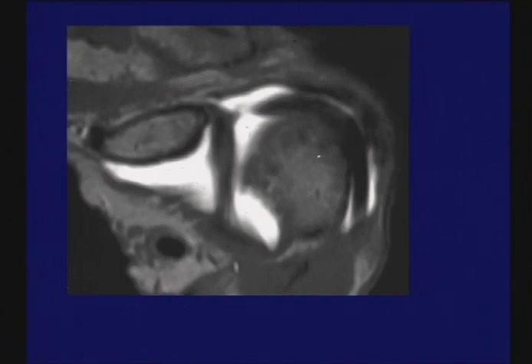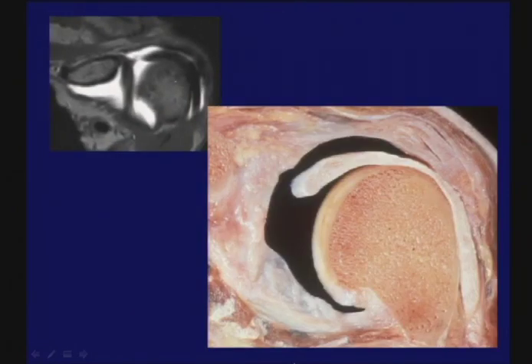And these you're looking at are the original images that were brought back to me to look at. And boy, now I started to think this may be something really good. I wasn't sure what I was looking at, but I knew it was good. Here's the contrast agent within the joint in the coronal plane. And this was certainly biceps. I had absolutely no idea what this was. We'll be talking more about it. And then they showed me the corresponding anatomic slice. And boy, I said, now you may really have something here. And that is how MR arthrography started.